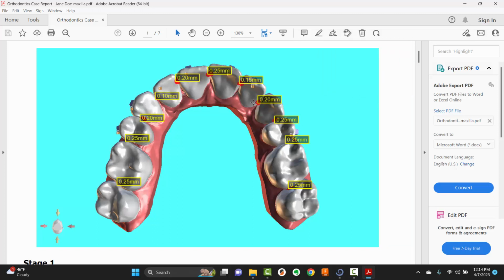The software also, if this number is actually 0.17, it says 0.15. If it's 0.22, it says 0.20. Some software, most softwares, to my understanding, round up because they don't want you to get into collisions where you can't proceed because then their software looks bad. But you look bad when you have a bunch of open contacts everywhere and everyone's getting food caught in their teeth. I would rather err on the side of caution. So like I said, that's how I asked the engineers to make it, to have it underestimate, or under display, I should say.